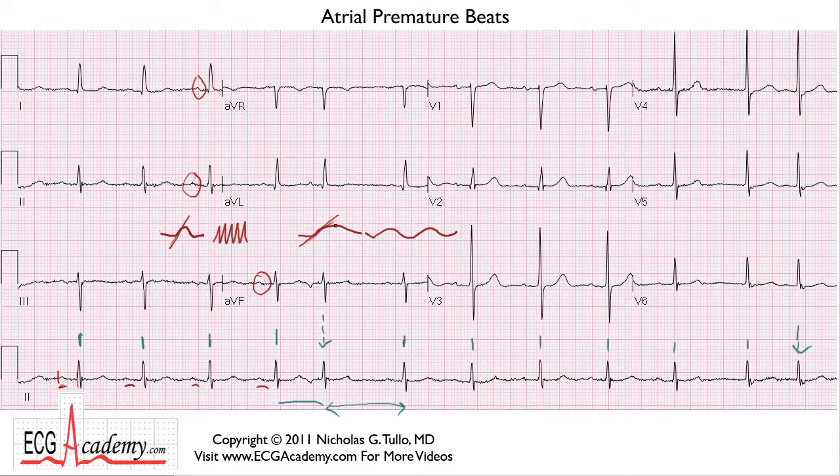Okay, so you can usually see a P wave superimposed on a T wave because it looks sharp, it looks spiky, it looks like the voltage changes rapidly. Well, you can see that here very nicely. If you look at the T wave from this beat, it's very smooth. And if you look at the T wave from this beat, you've got this sharp deflection at the very end of it that's clearly negative. And in fact, you can see it here in this lead as well. It's almost like the T wave here is a very broad, slowly changing signal that only goes positive, but here it goes in two directions.